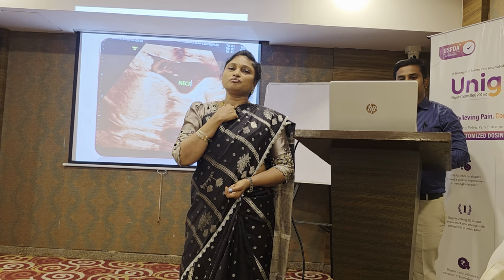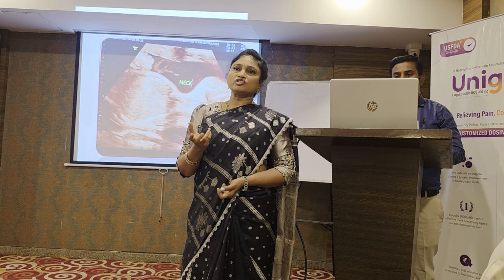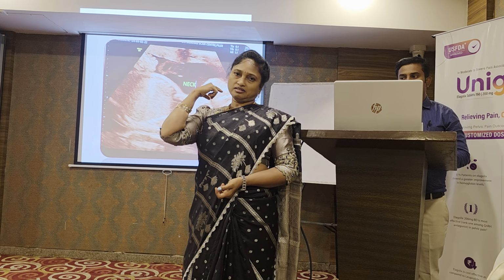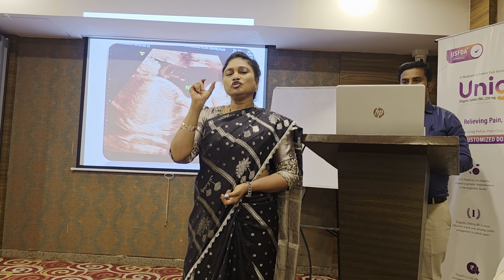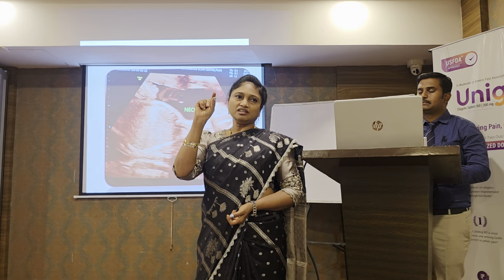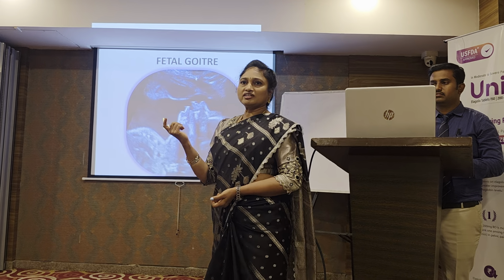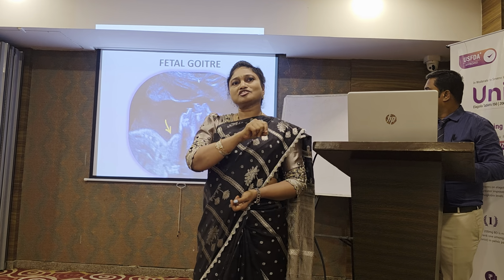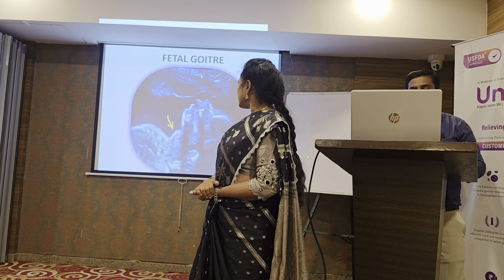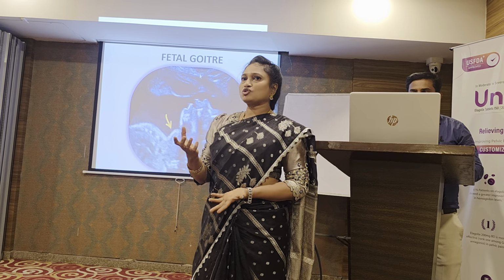Neck is very important, both anteriorly as well as posteriorly. Look for any swellings, especially the thyroid swelling anteriorly, and posteriorly what do we look for? Yeah, cystic hygroma. That is the nuchal translucency. Look for the thickness of the fluid in the nape of the neck. Next one. I think goiter swellings, in my 30 years of practice, I've seen only 2 cases. Very rare. But still, if at all the baby is giving a nice extended neck, you please look for it.